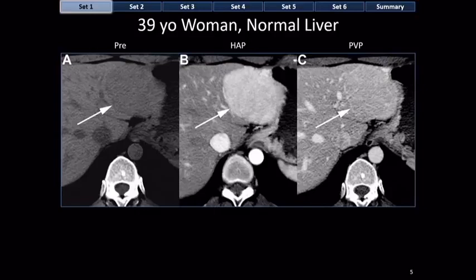And if you only had the portal venous phase, you might imagine on a busy day, you might go through that image and you might actually miss that mass entirely. So hold on to that, the mass that disappears in the portal venous and delayed phase. This mass has no capsule, the mass has no areas of necrosis or heterogeneity, and although it can be tough to see on CT, no obvious fat. So those are the descriptors.